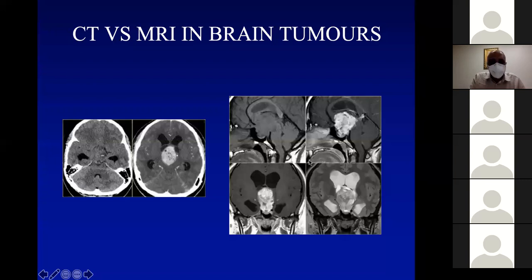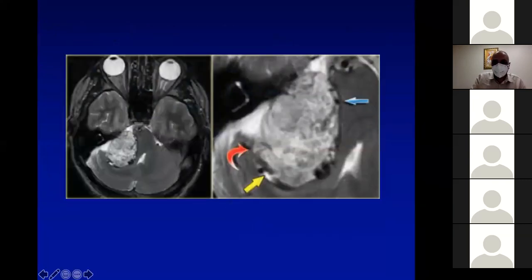These are MR images of the same patient. You could see the mass here, enhancing with contrast again. And on the coronal image, you could see that there is developing hydrocephalus. Another mass lesion. This is in the region of the posterior fossa, right CP angle.